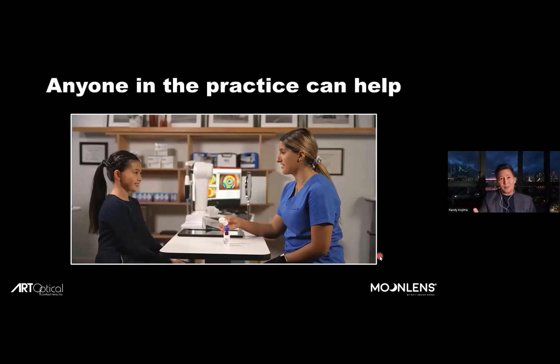Of course, you as the optometrist are likely going to do all of the exam visits, the slit lamp, the VAs and such, but you probably won't do the topographies, both baseline and post-wear. You might analyze them, baseline and post-wear, but you're probably not capturing them. So your technician doing all of this capture can collect the information, enter it into the site. It's very easy to do once you know what to look for.